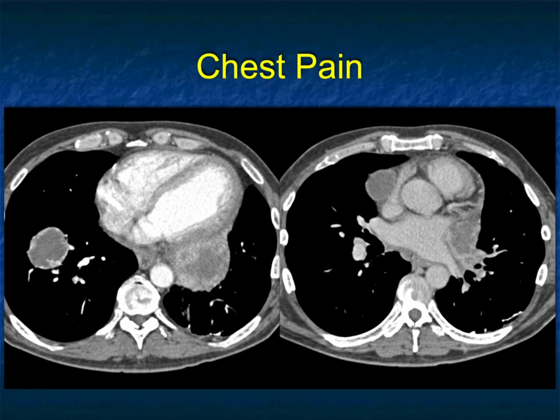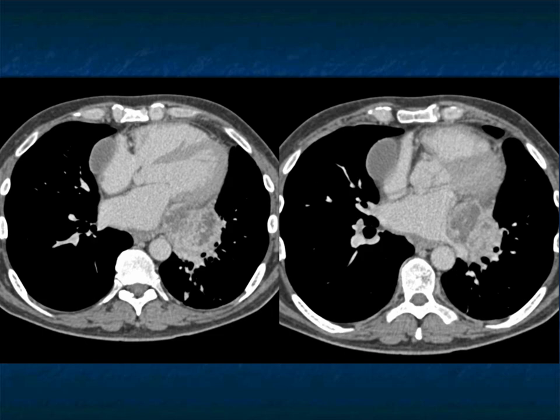Another patient with chest pain, there's masses in the right lung, but look at those masses on the pericardium or on the heart, here involving the patient's left atrium, maybe extending down to involve the patient's left ventricle. You can see how extensive this tumor is. It's somewhat vascular, it's somewhat enhancing, it's somewhat cystic and necrotic, and there are multiple lesions.